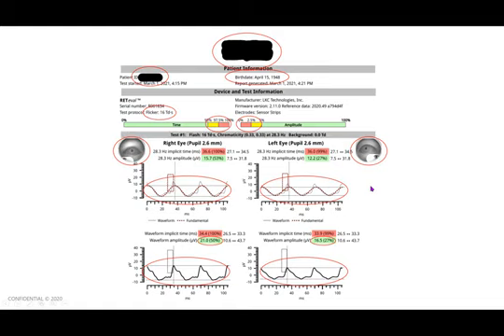The next piece of information I look at is waveform amplitude. This generally indicates retinal health, and a strong response or a response in the green indicates that generally you have a healthy retina. In this case, right eye, 21 microvolts or 50th percentile, just about average. And in the left eye, 16.5 microvolts or 27th percentile, a little bit less than the right eye, but still well within the green. So this to me indicates that this retina generally tends to be healthy. There's a good response.